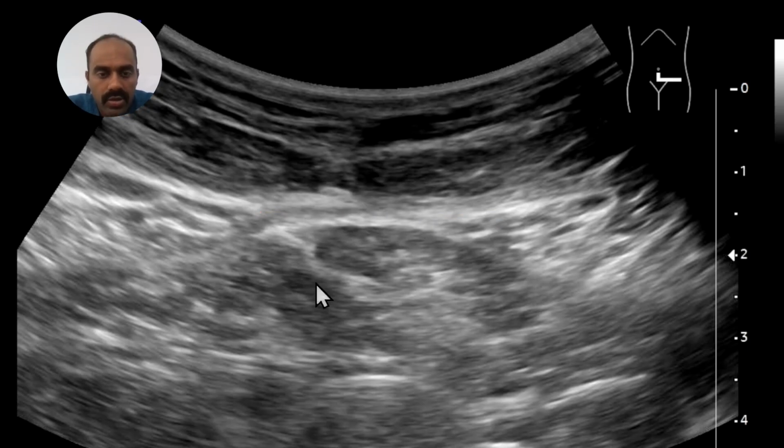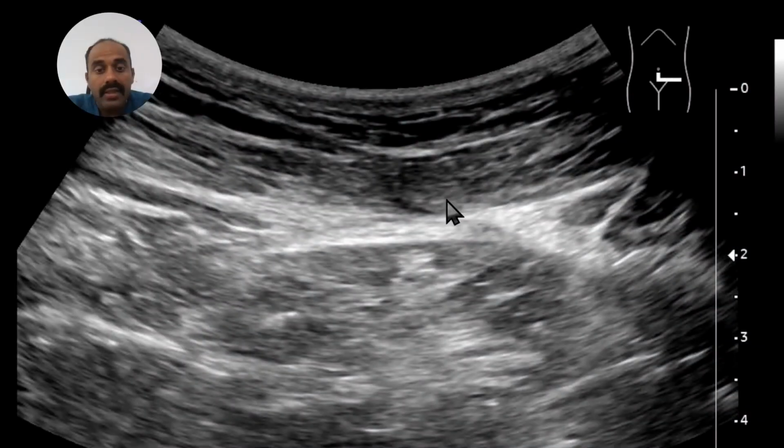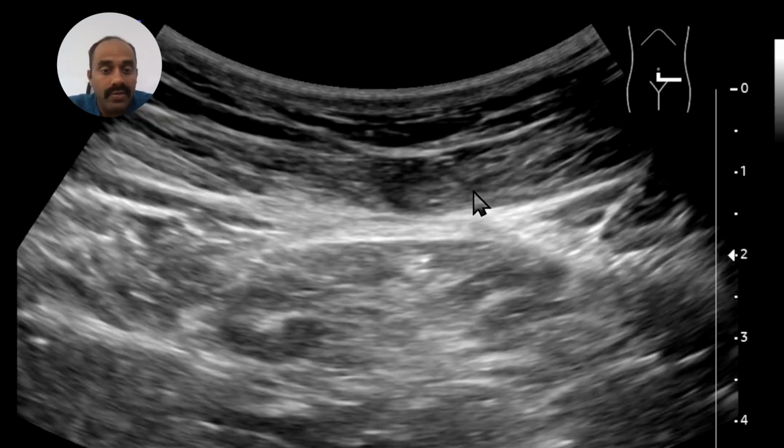Closer to the xiphisternum and closer to the pubic symphysis, we are looking at a normal range of somewhere between 15 to 16 mm. Towards the umbilicus, it progressively increases from 15 to 20, 25 to 30 mm. But divarication of recti is more of a clinical diagnosis, where we can visibly see, if we ask the patient to raise the head in a supine position, an abnormal bulge. But the difference between a diastasis of the recti and a hernia is that the linea alba would remain intact, thinned out but intact, in a case of diastasis of the recti.